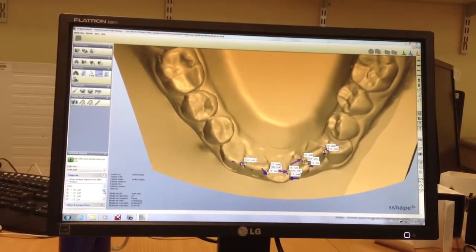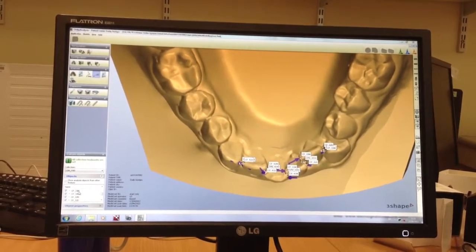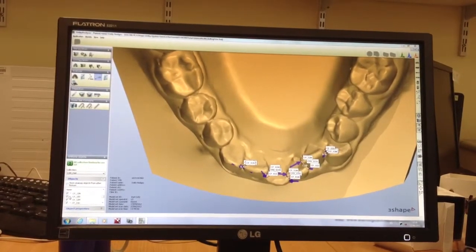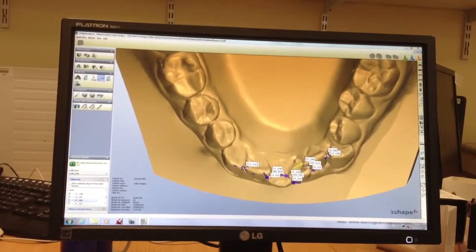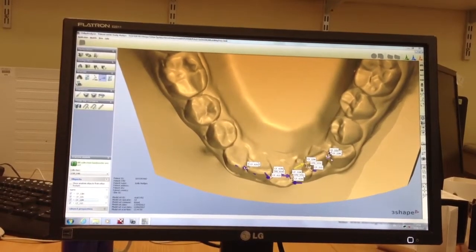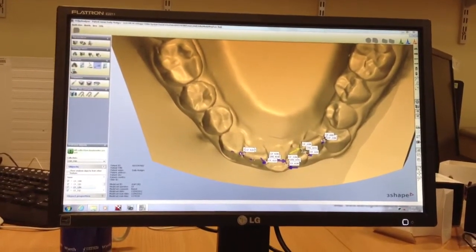When we get to that point, which is quadrant 3, tooth number 3, so 3M, we would uncheck that point, and manually jump onto the next available point, which is quadrant 3, tooth number 2, M. That tooth doesn't exist, so we don't select that point, and we don't bother selecting that contact point either. We would jump straight through to the next one and continue on from there.